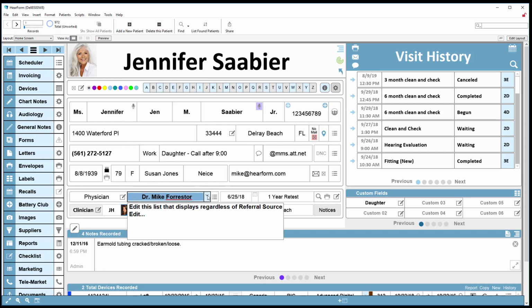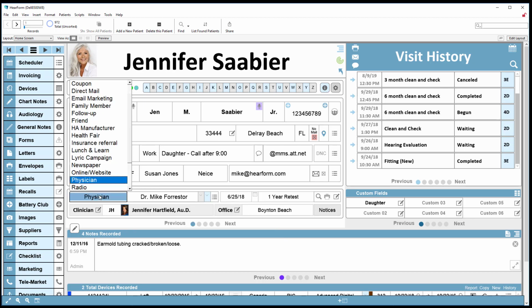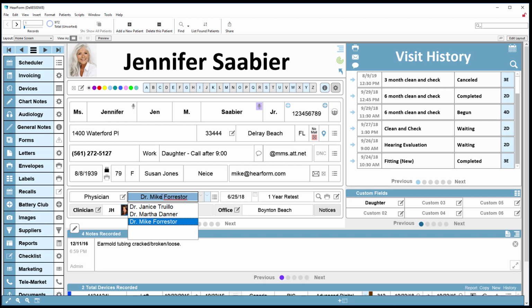And then finally, I can customize this list, which is not specific to what's in the first field. That list will always put the same number of choices in the third choice area, not dependent upon what's in this first field. So in other words, play around with it and you'll see that you can enter information one of 3 different ways, making it a lot more choices than we used to have.